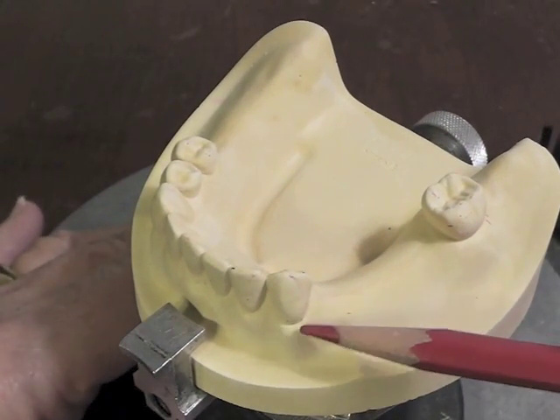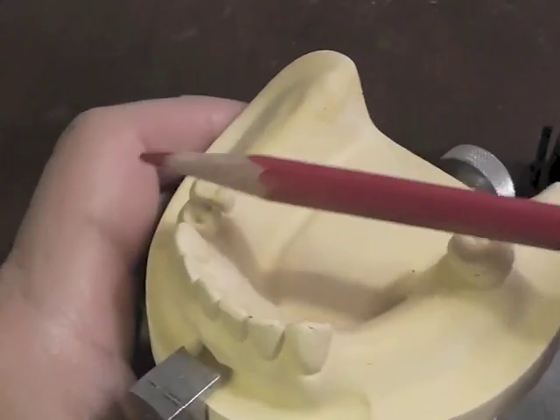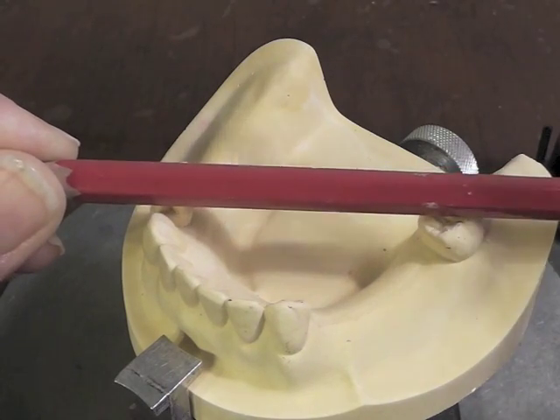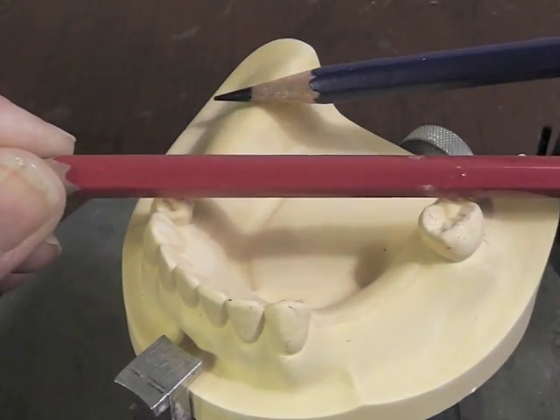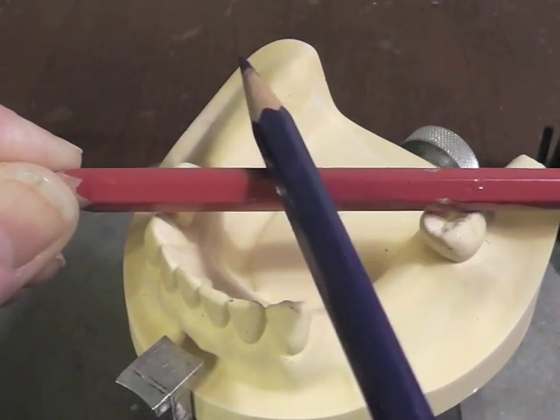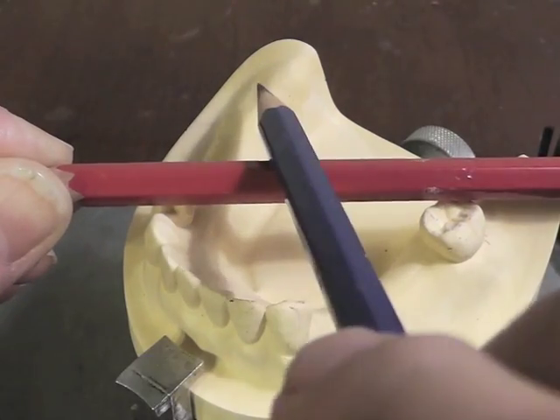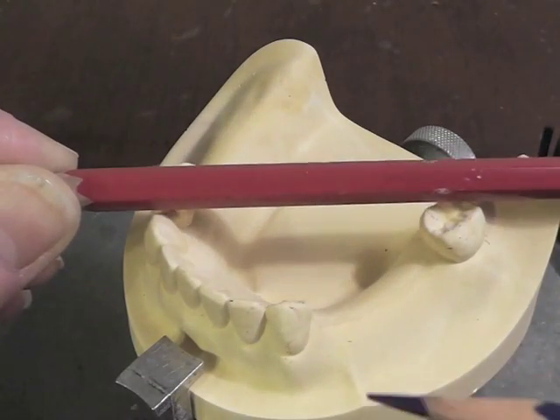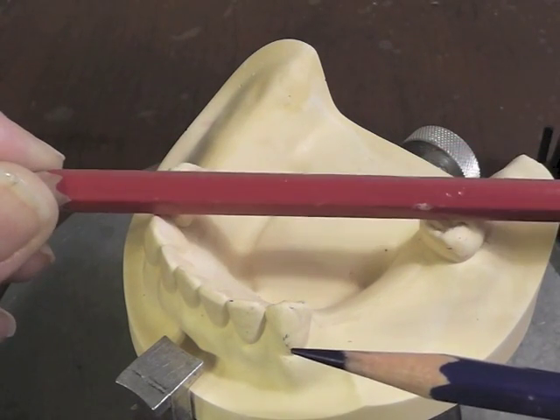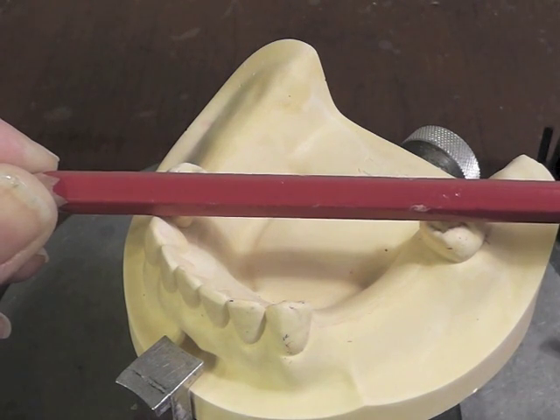On our canine up here, on the mandibular, because that tissue over there is kind of flabby or not terribly supportive, our tooth wants to pull back like this. When we chew down on something, our partial wants to do this type of action. We might put something more flexible as far as clasping on that particular tooth that we have here.